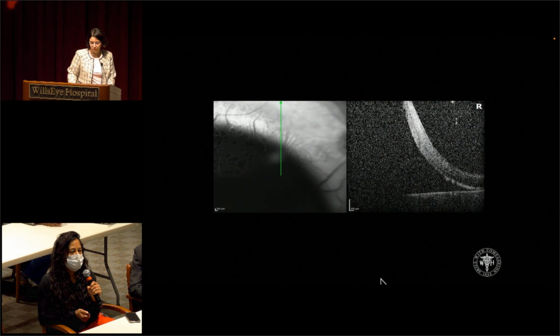And then here we have a vertical cut OCT of the right eye, slicing right through that border of the mass. This looks like it's over the macula. And we see this large dramatic elevation of the retina with a large area of subretinal fluid.